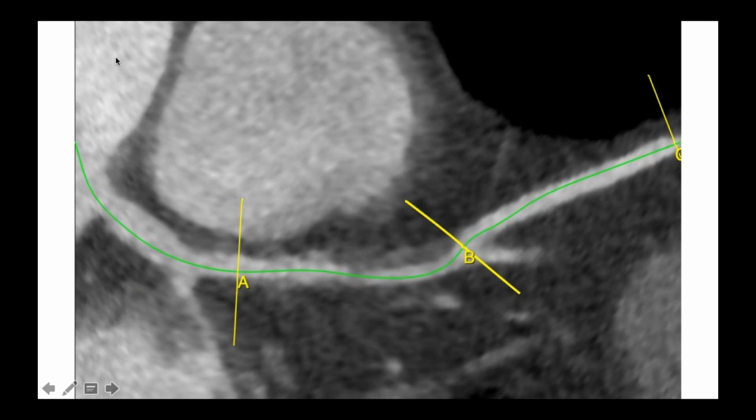This is an intramural hematoma actually, and I've been putting together a talk on SCADs, and I looked at our PACS system, and I found 272 since 2015. So that's why I downloaded a few cases. This was a really pretty one.